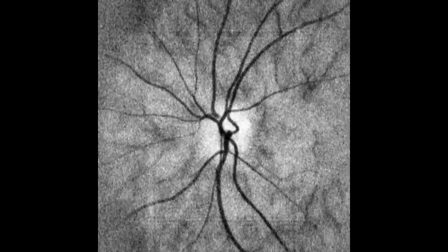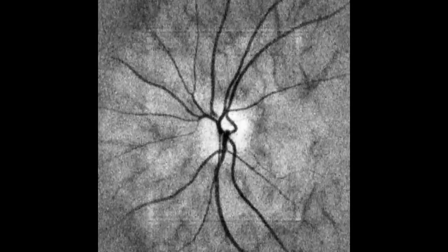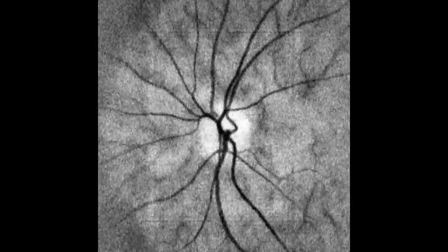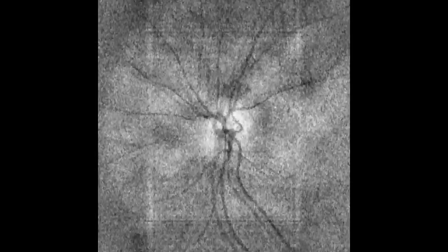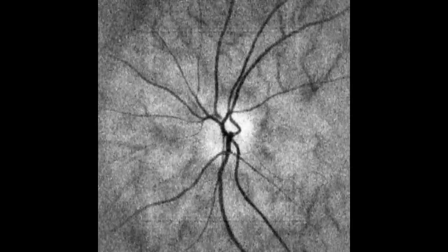To enhance their visualization, some signal processing can be performed with Holovibes. Each image is divided by a blurred version of itself in order to flatten static image contributions. That creates this kind of output that better reveals small signal variations in retinal vessels.